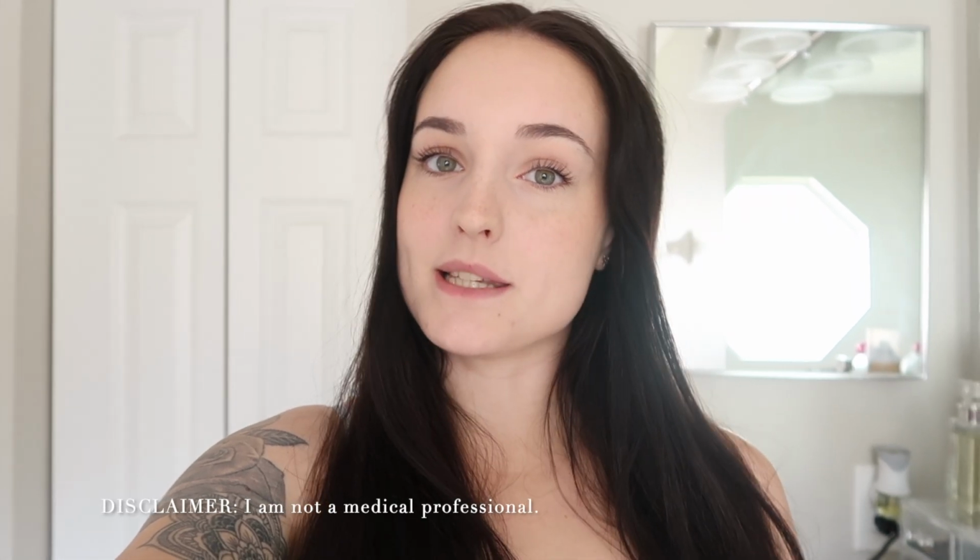Today I'm doing a video on how to accurately read an ovulation test. Now these are quite tricky, because compared to pregnancy tests, where two lines, no matter how faint the test line is, means positive, with ovulation tests there is always going to be two lines, and that is why it can sometimes be really confusing. It's about the darkness of the test line, which is how you are going to know what level of fertility you are, whether you are low, high, or peak.